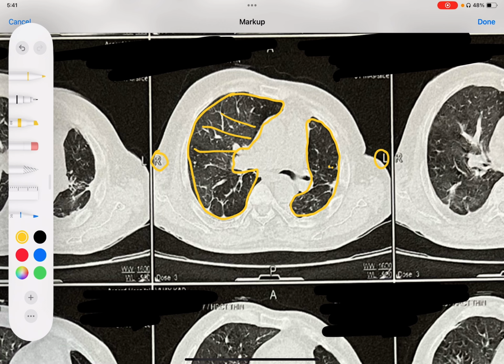Actually, the lung should not be this much smaller. The thing is, we know the mediastinum. These are the lung parenchyma, and this central structure is all mediastinum, where we have the heart. So, these are two bronchi, because we can see the blackishness. This black is all air, and there is only one structure of this much caliber, the trachea. So the trachea has divided into the left bronchus and right bronchus.